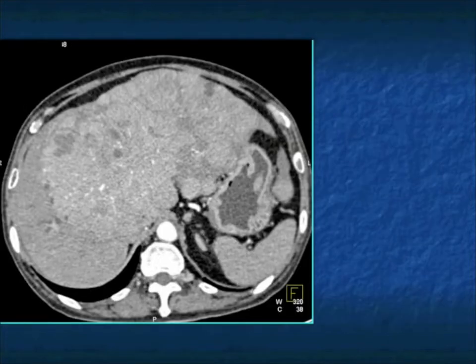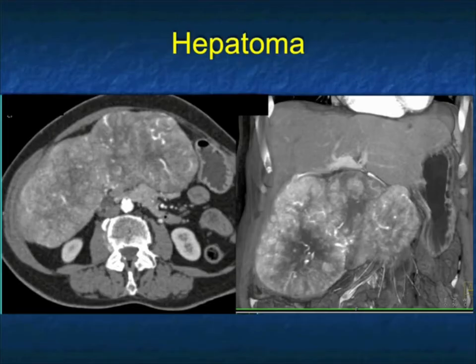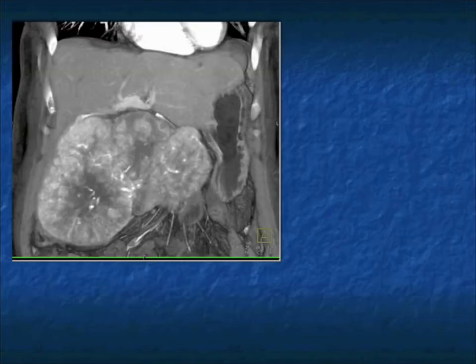You can see that here's the tumor. You see the difference in texture as you go from arterial to venous phase. There's portal vein involvement. And again, tumor is infiltrating in low density. This is a tumor that the patient will do poorly with because of the neovascularity and the fact it's a high-grade tumor. Another example, cirrhotic patient, hepatitis C. Look at this large mass projecting off the inferior right lobe. For a second, it almost looks like a neuroendocrine pancreatic tumor, but there it is here.